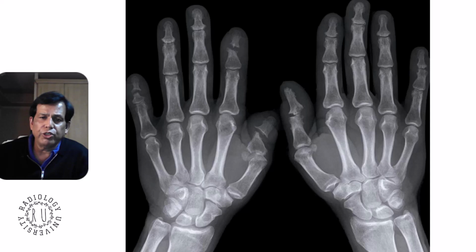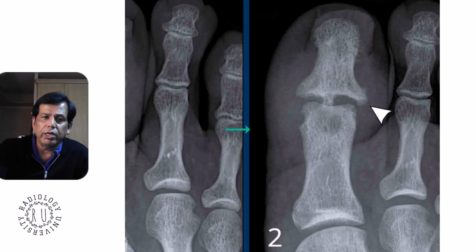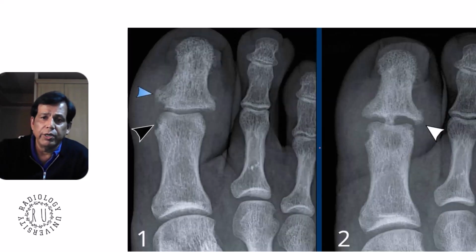Not much of a soft tissue going on. Cup and pencil. So this is more of a psoriatic arthropathy. Yeah, psoriatic arthropathy. This is again inflammatory and psoriatic. So in early stages, you can see the erosions are mainly on the edges of it, and there is more of a new bone formation like what you get in enthesitis where the tendons are attached.